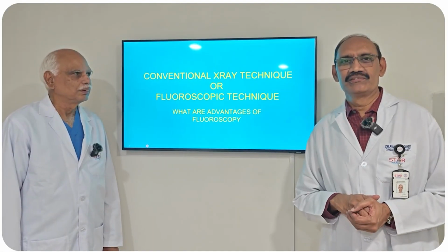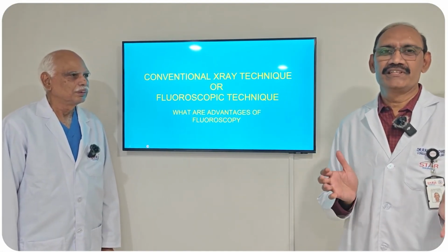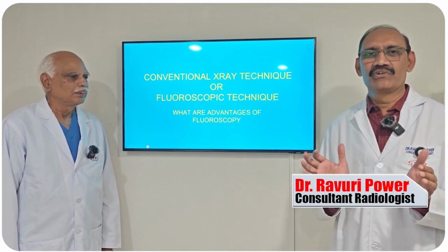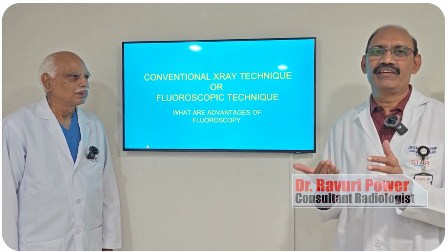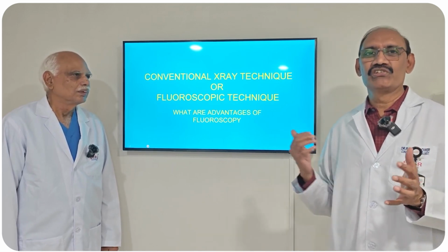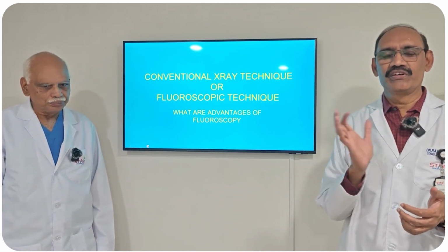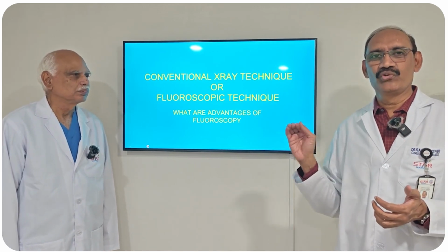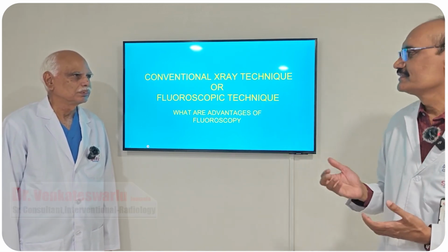Now in this video, we'll see what is the difference between a static image and a fluoroscopic image, because fluoroscopy has a lot of advantages and more information compared to a static image. So Dr. Venkateswarlu will explain to us the difference between a conventional or static versus a fluoroscopic image of HSG.